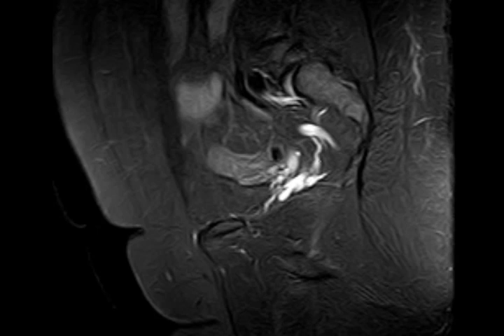First of all, what's this exam? Pelvis MRI, okay. Female patient.